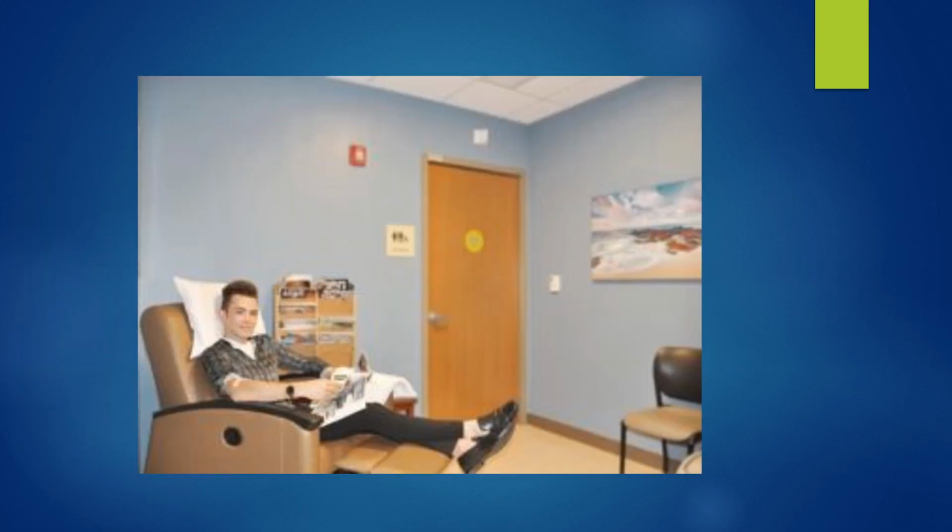This is an example of what an uptake room would look like. Of course, this looks very different depending on whether it's mobile PET or if it's in a hospital. But patients should either be in a private room or sometimes you'll have more than one patient in a room separated by a curtain or partition. But this is a pretty typical uptake chair. You want your patient to be comfortable because they're going to be sitting there relaxing for about 60 to 90 minutes. And it's always a good idea to make sure they're warm, give them a warm blanket because that helps reduce the muscle and brown fat uptake as well.